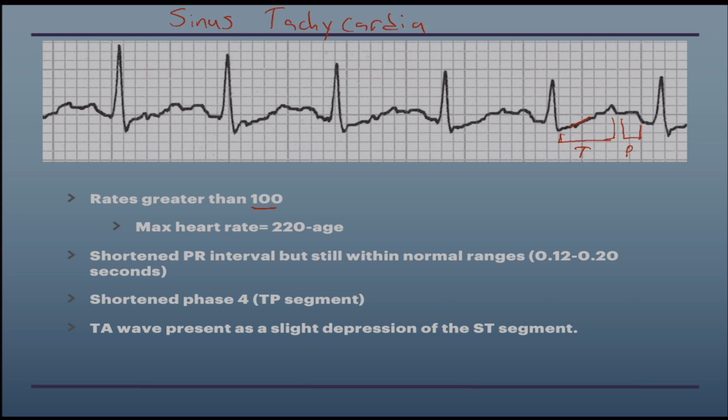If you imagine a camel's back, see how that looks like a camel hump? That's because the EKG is seeing basically two things occurring at the same time. The ventricular repolarization is still occurring, so it's capturing that, and it's also capturing this atrial depolarization, and it's fusing those waves together on the EKG.